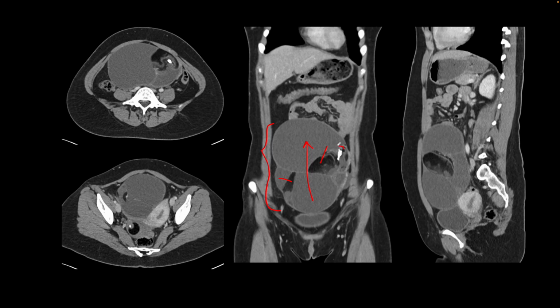It has some peripheral high density components which are teeth inside the dermoid cyst, and also on the axial image we find that there is a second dermoid seen more posteriorly with similar attenuation, macroscopic fat, and a peripheral focus of high density, which is a tooth in a mature cystic teratoma or a dermoid cyst.